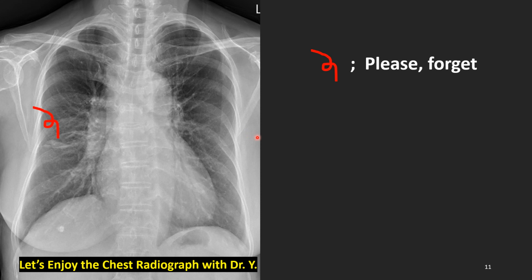Let's start the real pathology in the hilum on the chest radiographs. This is the first case. Let's remember once again the normal, healthy young man's hilar anatomy. Let's presume left side of hilum is okay with this woman. What's wrong with the right side hilum?